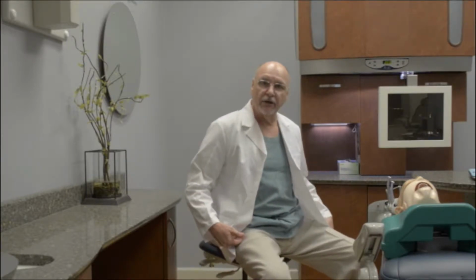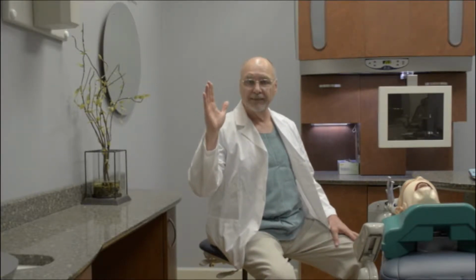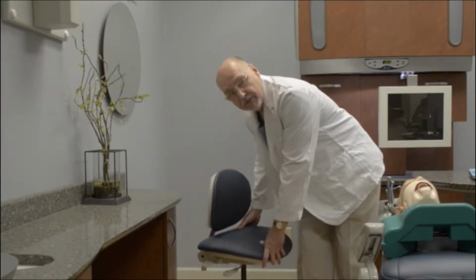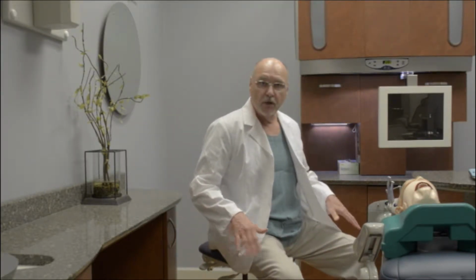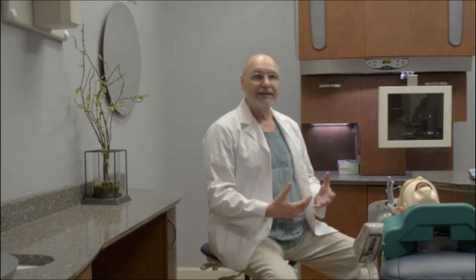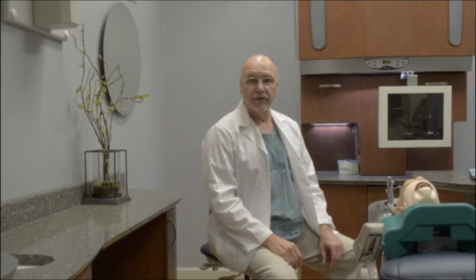So a small angulation here is desirable to be able to hold the back up vertically without the use of muscle. In addition to that, we want to be able to have a seat that has a positive pelvic tilt to it. By moving the pelvis forward into a positive gradation, we're able to move the vertebra perpendicular to the plane of the floor, and now you're able to hold your back in a straight position without the use of muscle. This way you can sustain a position that is ergonomic all day long. But if you had to use muscle, you probably couldn't hold your back up for more than a few minutes.